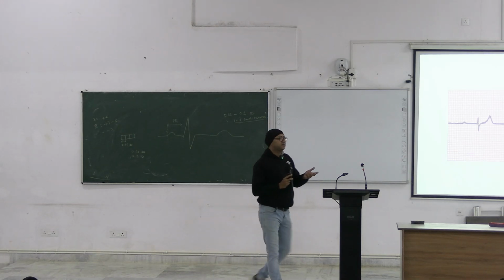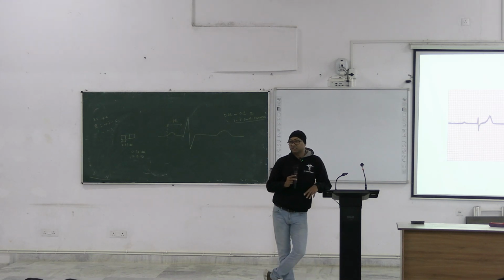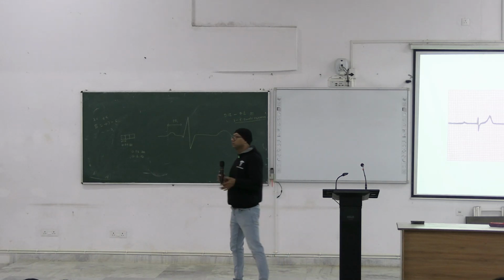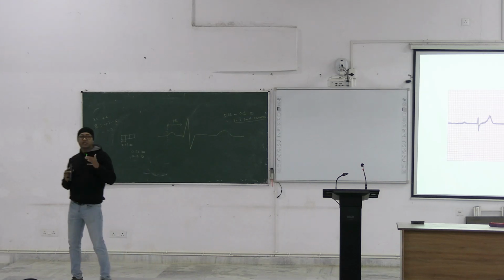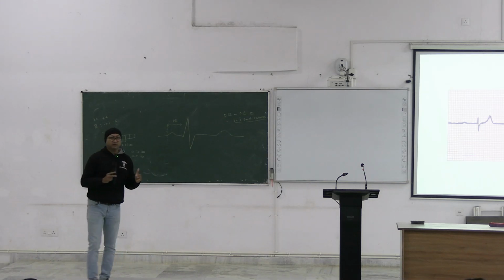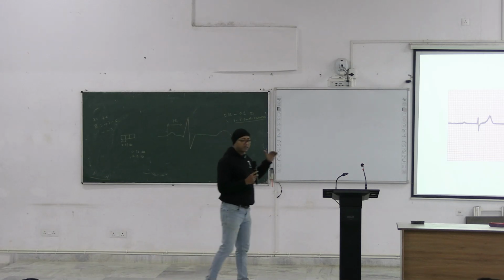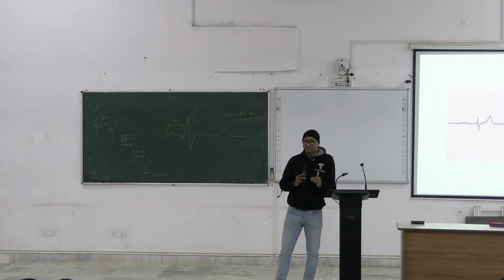In your practical examination, in OSPE, objective structured practical examination, maybe some abnormal ECG will be there. Within abnormal ECG, you need to identify a few abnormal ECGs, out of which the most important is acute coronary syndrome. Next is the heart block. Heart block ECGs will be placed in the practical examination, and you need to identify them.